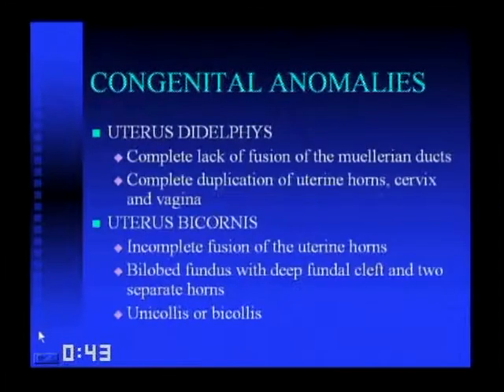And congenital abnormalities are particularly well demonstrated on MR. This is one of the applications where you wouldn't want to use FAT-SAT with your T2 sequences. You can cut down time, and actually the outer margin of the uterus will be better delineated against the fat if you don't use FAT-SAT. So this is a good one to not use FAT-SAT sequences on your T2 fast spin echoes.